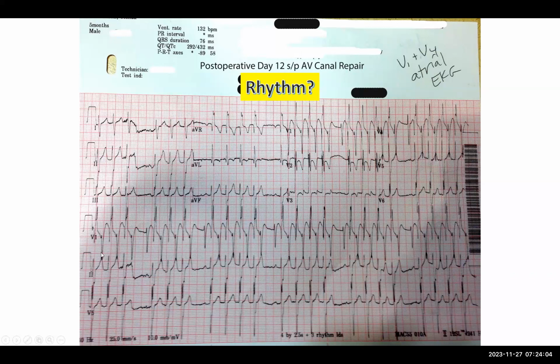And we look in V1 and we see this very large, sharp signal, which does not look like anything we normally would see on a surface electrocardiogram. So this is the atrial electrogram, because someone has told us that they've attached the atrial wires to V1 and V4. So we're on V1, and we know this is the QRS because we're looking at leads that don't have the electrogram attached to them. So when we're coming down here, this is the QRS and this is the A.